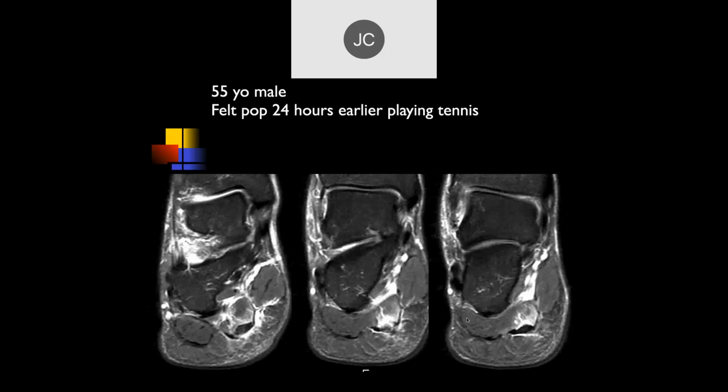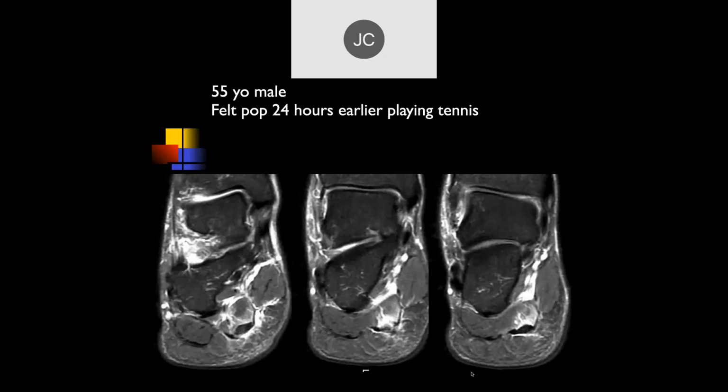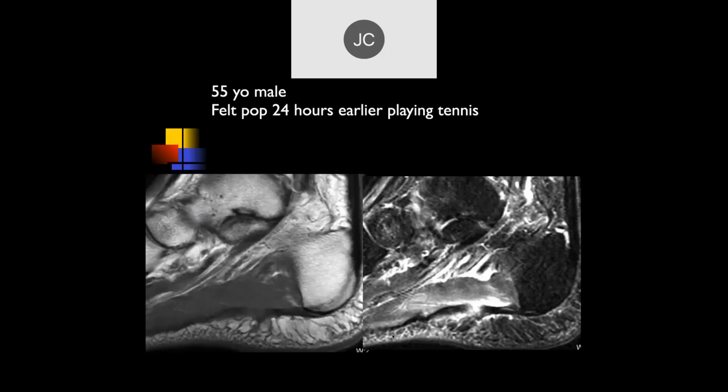In these more distal tears, especially when they're complete like this, they tend to occur, in my experience, more commonly in young athletes who have a marked increase in their training and the stress on the plantar fascia, as opposed to older individuals where the injury typically occurs right here at the origin. Though I think even in most younger athletes, the injury occurs more at the origin from the bone. But in some of these athletes, we see more distal tears within the plantar fascia.